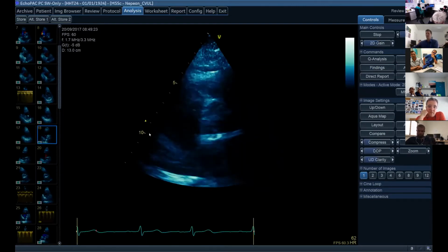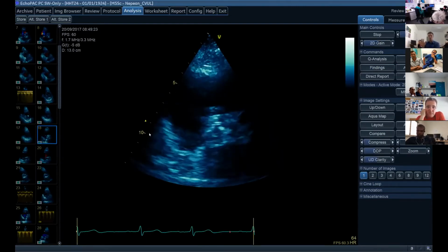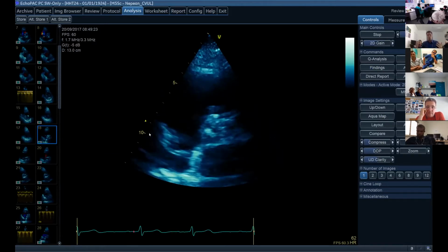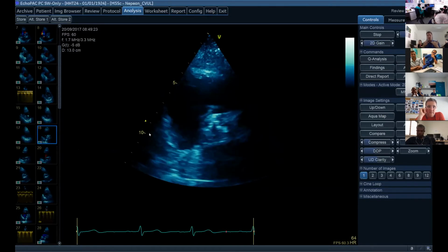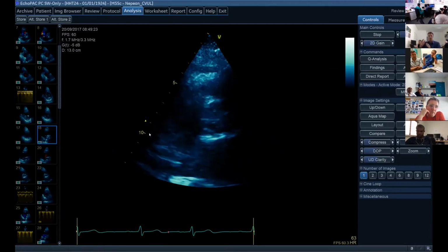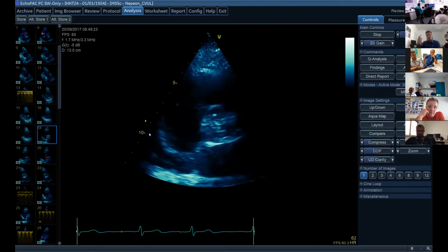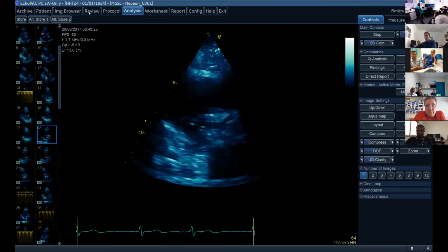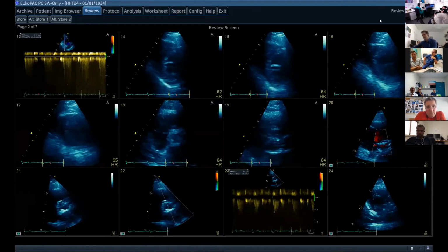You get the idea. If I show you an aortic valve that looks horrible and you've got a big blown out left ventricle, you've got to know that we're probably going to be looking at low flow states. So that means that all the valvular gradients are going to be lower. So just trying to think ahead like that, I believe is really important. Okay. So bearing that in mind, let's move on to the next one.